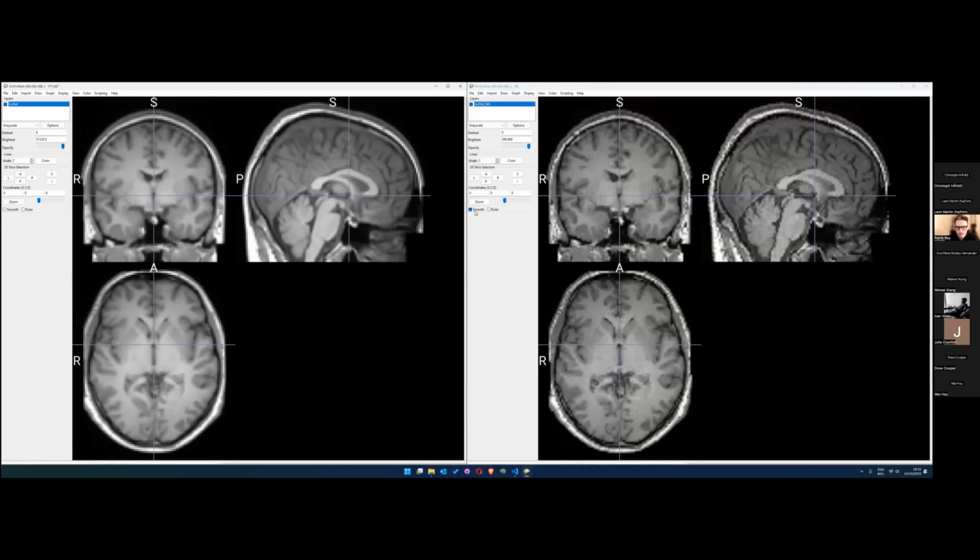Especially if we actually remove smooth as for the visualization, we see that the actual intensity values that we see here are not as smooth as the values that we find here. So we already see here this one simple parameter in one registration call already creates this difference in registration results. And we've noticed before, right, if we talked about surface extraction, segmentation, how these single voxel values, the actual values of those, matter to define where borders are, where surfaces, etc.